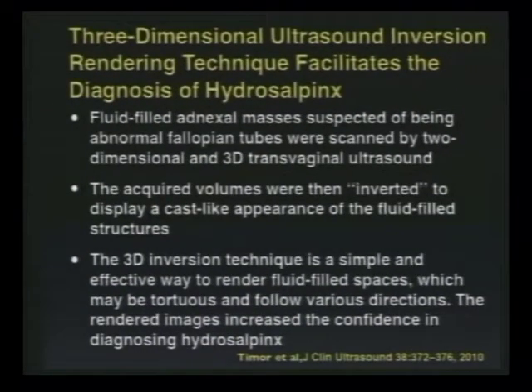There is a special three-dimensional technique called the inversion rendering technique, which facilitates the diagnosis of hydrosalpinx. It was described by Timor et al., and the acquired volumes were inverted to display the cast-like appearance of the fluid-filled structures.